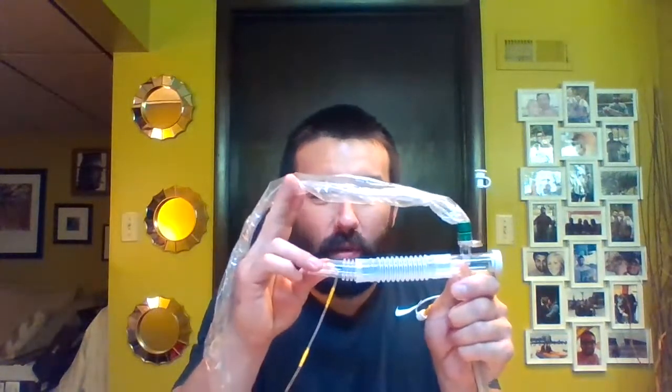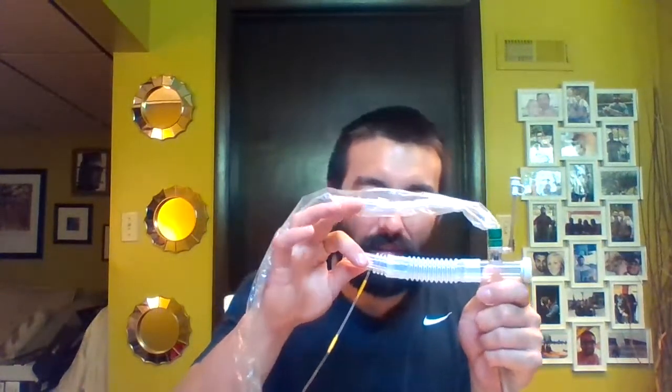You could hook this up in line with your ambu bag as well. You can see it goes on right like this here, and this end can hook up on the endotracheal tube. Likewise, as I told you, I like using my inline suction. If you had that hooked up, you can have that straight in over to here, so you get it away from the ET tube, and if a bunch of stuff comes spraying up and out, you don't have to worry about it so much. We'll go over the inline suction a little bit more in a second.